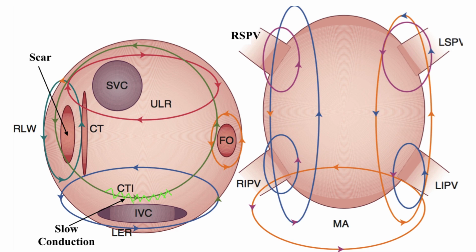Left atrial flutter originates from circuits around structures like the mitral annulus or prior ablation scars and produces atypical, irregular flutter waves, often without the classic sawtooth. ECG clues include non-sawtooth morphology, variable P-wave axes, and unusual lead patterns, especially in V1.